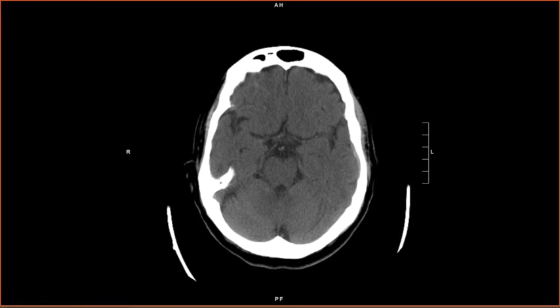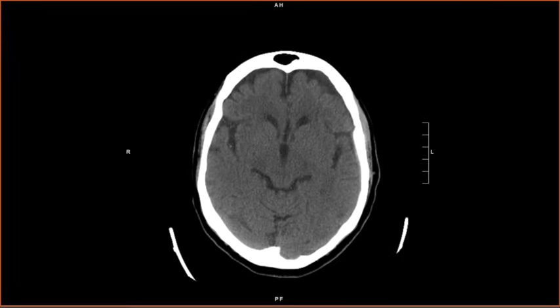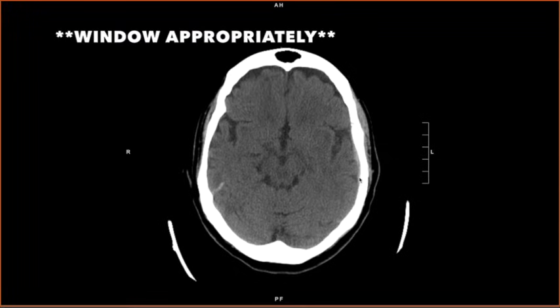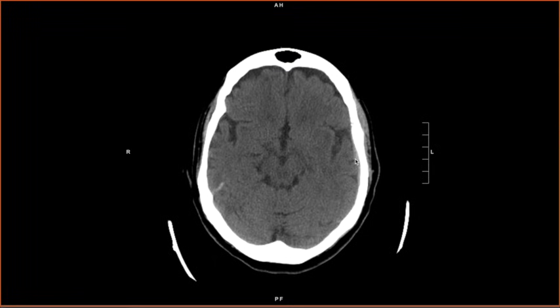And look, there's a decently sized subdural hemorrhage right here that was nearly impossible to see on normal brain windows, but because we windowed it, it sticks out. So again, very important to know how to window so you don't miss this. They can be bigger and still blend in with the bone if you just use a normal brain window, so this really reinforces the concept of the purpose of looking at blood windows.